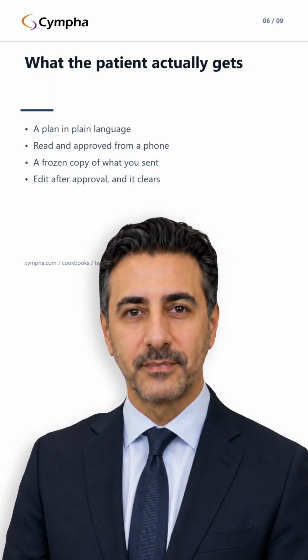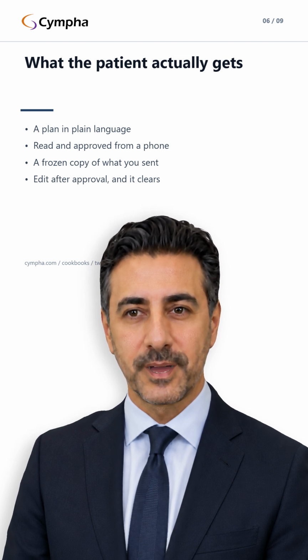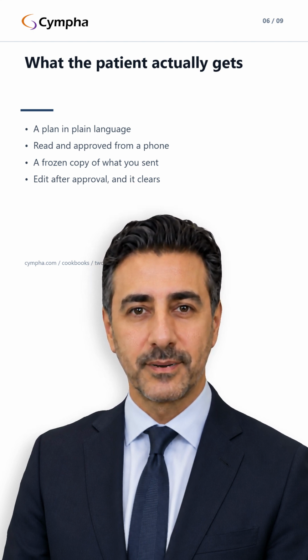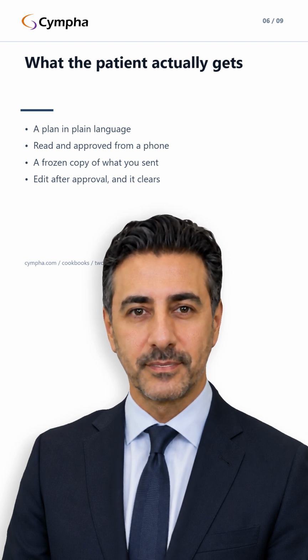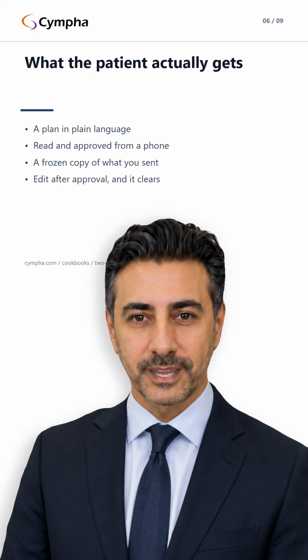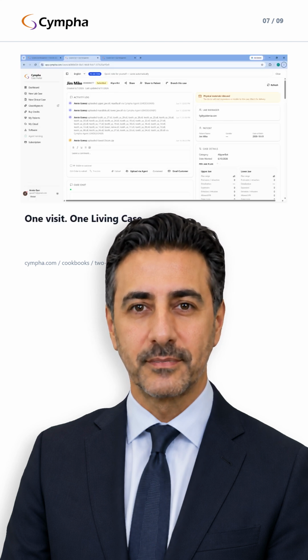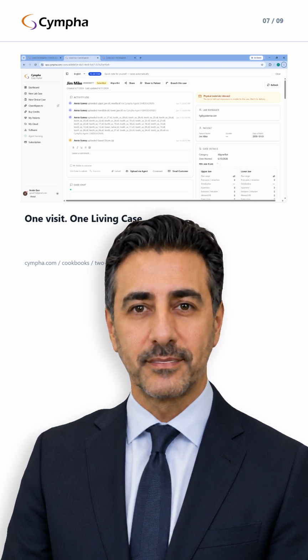When the plan is ready, the doctor shares it, and what the patient reads is written for them, in their words, and it looks like your practice. They approve from their phone. Here's the quiet safeguard. The patient sees a frozen copy of exactly what you sent. Change the plan after they approved, and cympha clears that approval and records why. Nobody is ever bound to a document they never saw.